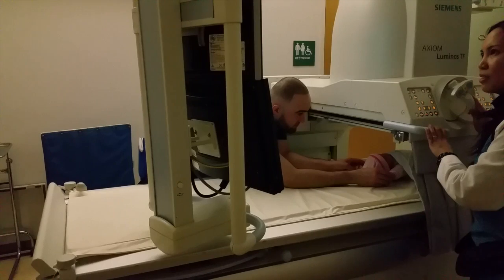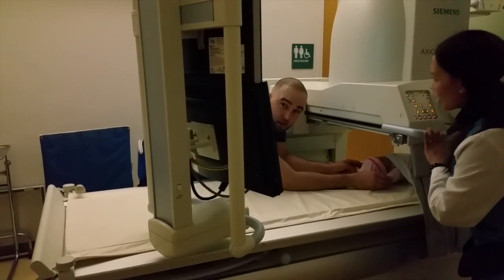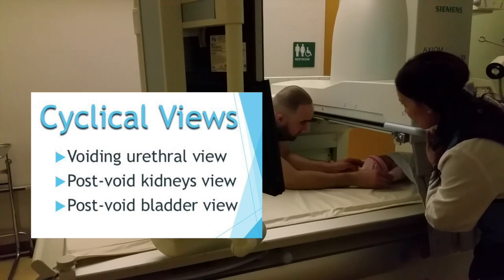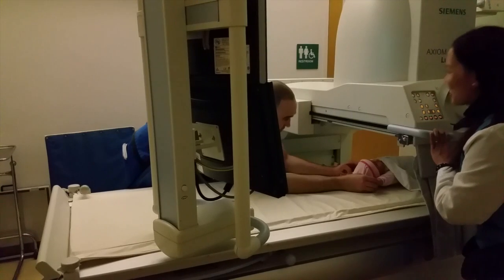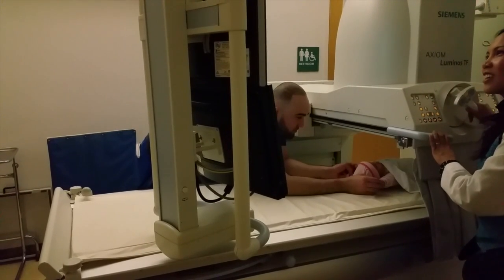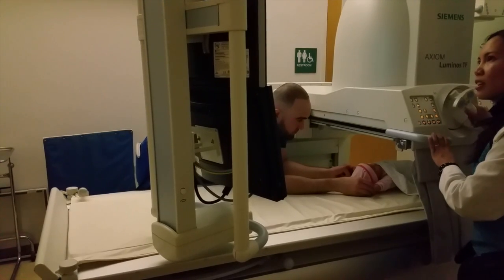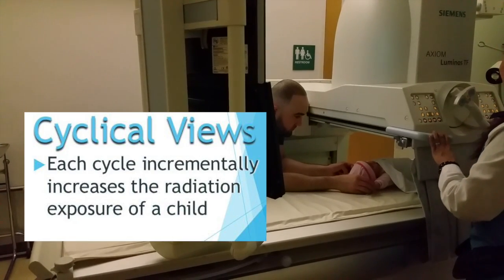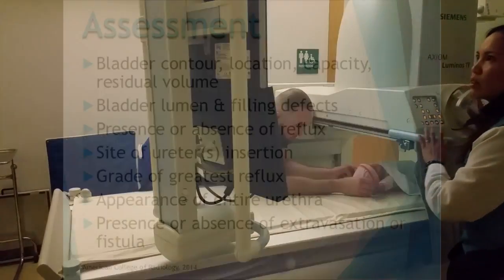In cyclical studies, the following views should be obtained with each filling: a voiding urethra view and a renal and bladder view following voiding. Obtaining a second voiding cycle has been shown to increase the detection of vesicoureteral reflux with each filling. Keep in mind, however, there's a significant increase in dose to the patient with each cycle.